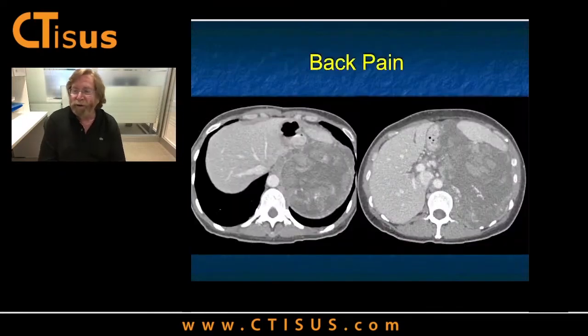Okay, let's keep going. I'll give you another one. Wow, here it's hard to tell where the masses are rising, but those of you who come to my quiz and are allowed in, you know that when I put something in the adrenal section, it's not by accident. So you could say retroperitoneal sarcoma, good thought. Really big mass off the pancreas, not a great thought, but a reasonable thought. Maybe a big renal mass.